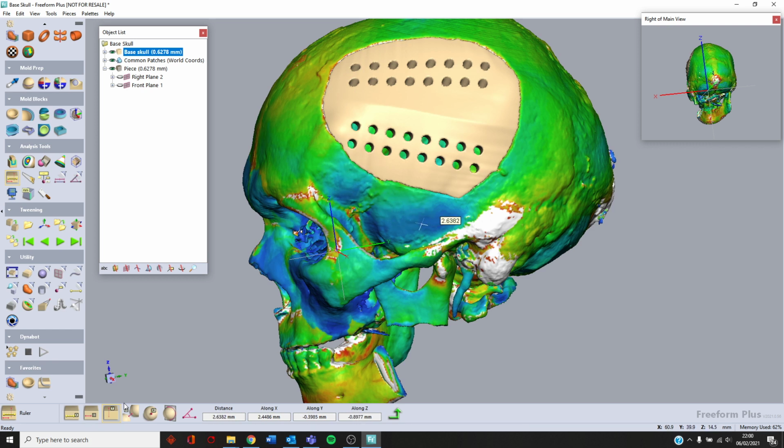We got 4. We got 2. Yeah, so obviously the bone down here is much thinner than the bone around here. If I hover over the white area, we've got 21, 28 in some cases, so much higher. I could quite easily go back and readjust the values.